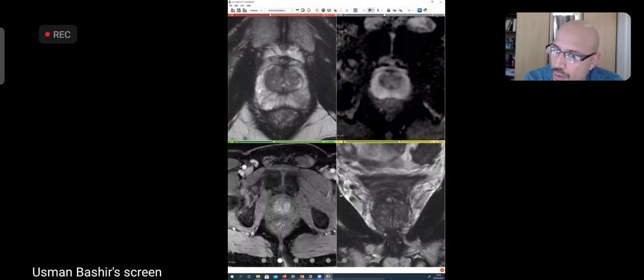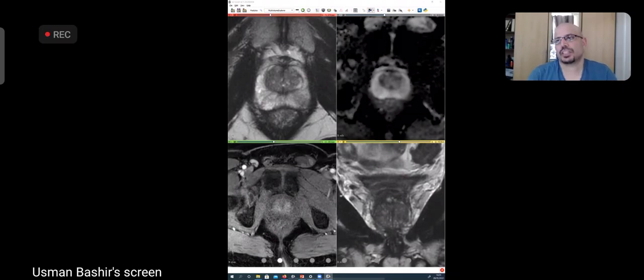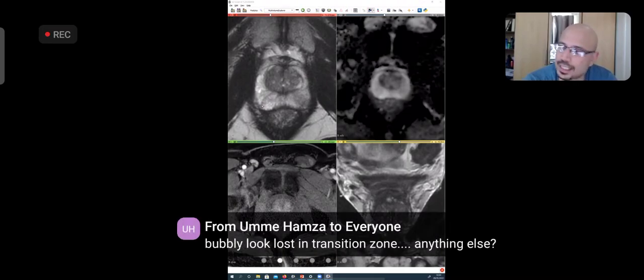Okay, so I hope that I've described a little bit about how to use PI-RADS classification to pick up lesions. I did not go into much detail of what constitutes a PI-RADS 2 lesion. The descriptions are there, but I can just give you a rough idea. Obviously, something very dark, very large is a definite cancer. Something that looks like lines or wedges is non-cancer. Things in between are PI-RADS 3 where you scratch your head a little bit. Okay. Any questions?